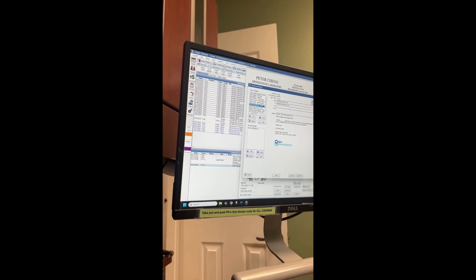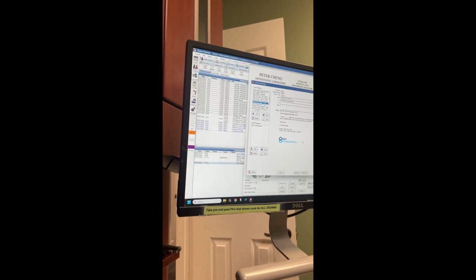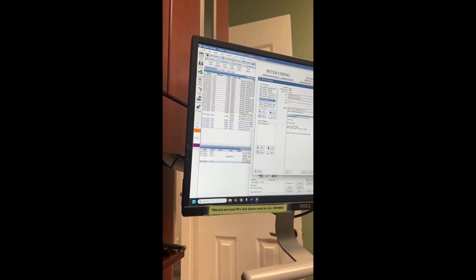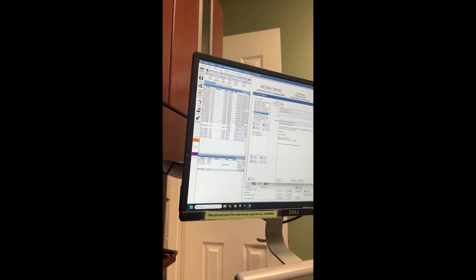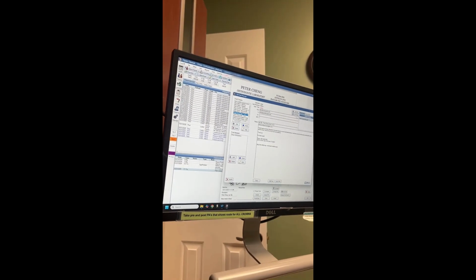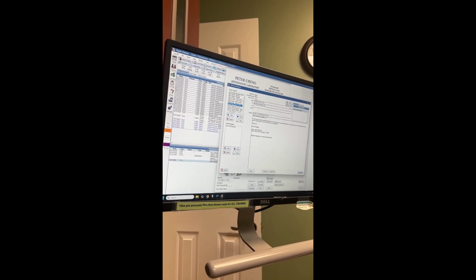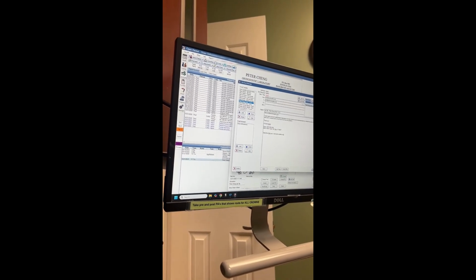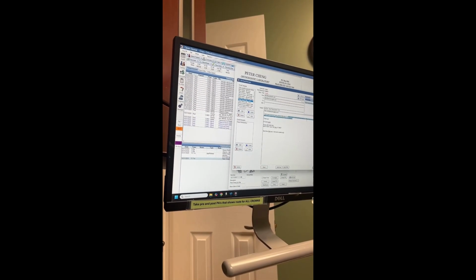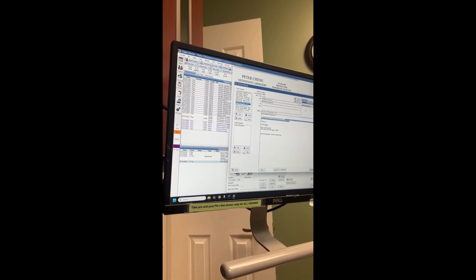Yes. I need to edit text. It's just a template. Need upper and lower retainers fabricated. Email only lets us send small attachments, so I'll send one arch in this email and the other arch in the other email. Let me know if you have any questions.